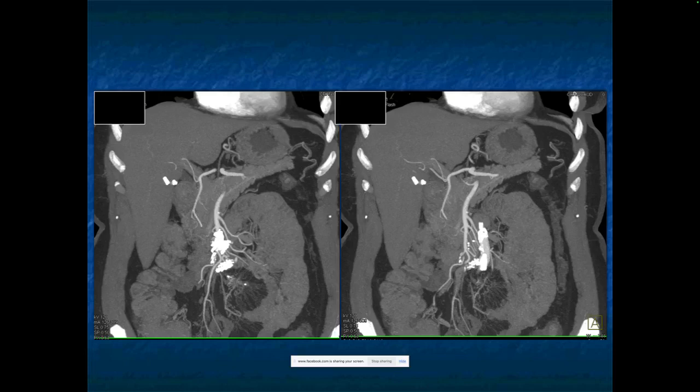It doesn't look like calcified nodes, and lymphoma only calcifies once it's been treated. Things like TB theoretically can have calcified nodes, but just one clump in the center would be unusual. So typically when I see this, I'm thinking carcinoid versus sclerosing mesenteritis. Carcinoid, I like to see more desmoplastic reaction. I like maybe to see a mass, though I always don't see it in the small bowel that's vascular. But it has more soft tissue mass.